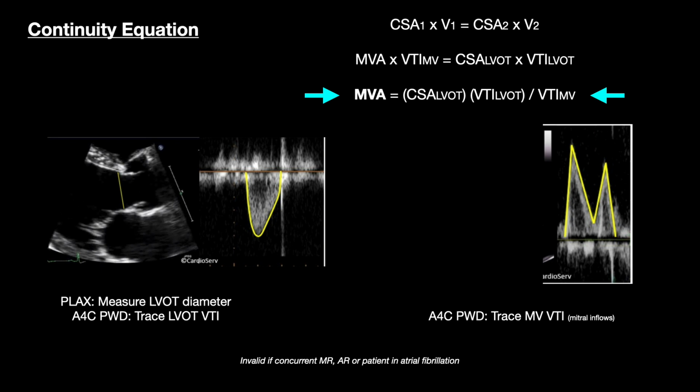You can use the pulmonary artery stroke volume to plug into the equation, but that's a little bit harder to image, in my opinion. So I don't do that unless I have to.